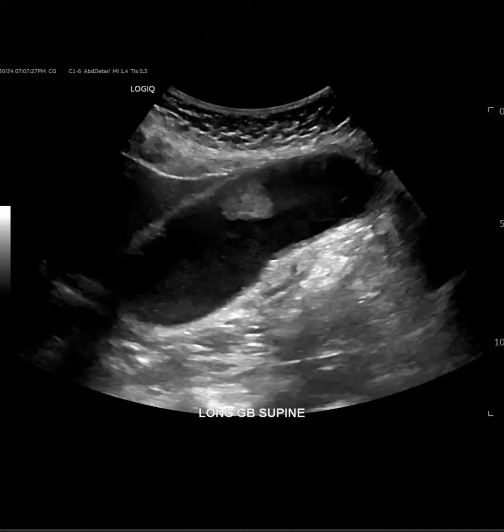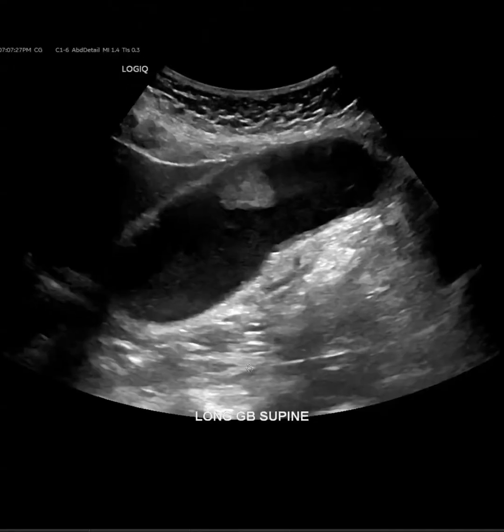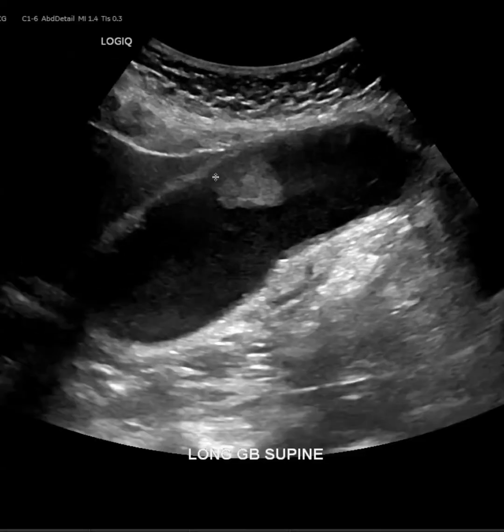All right, I'm going to share this other screen. The patient came in with right upper quadrant pain, and they did a right upper quadrant ultrasound looking for cholangitis. This is what it showed. So there's a polypoid mass in the gallbladder.